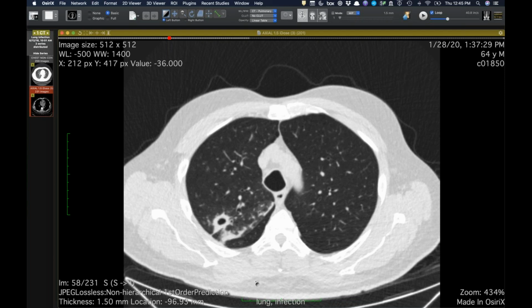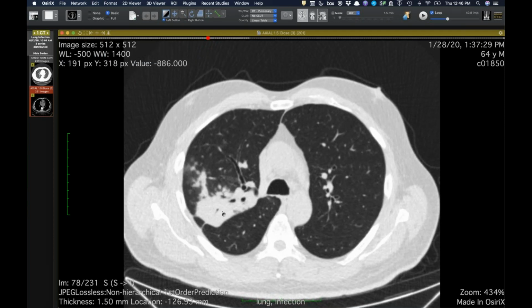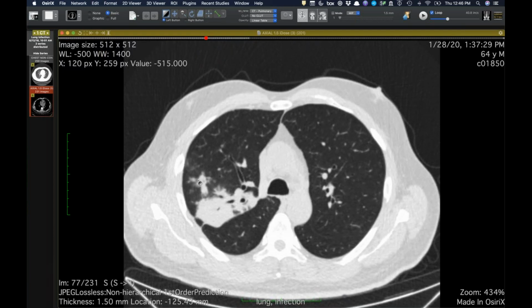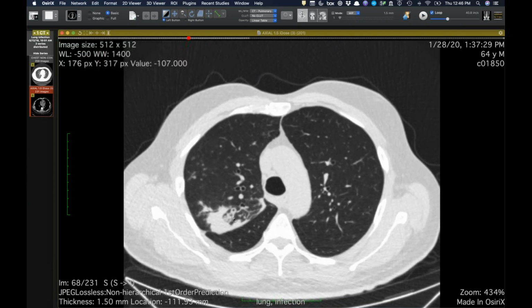I was trying to dig up questions in there, but here's a question we try to avoid. So when you're reading these screens and you get one like this, do you call it a Lung-RADS 0 and treat them and bring them back, or do you? Well, this is a question. I'm curious what everyone thinks. Let's just say you have this, right? If you just have a region of consolidation that's new, or you have new centrilobular nodules, because we have a lot of debates about this, I often will call these a 2S, whereas some people will call it a 4, a 4A, whenever they say it's a nodular area of consolidation. Or do you call it a 0?